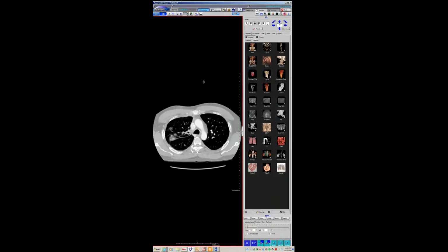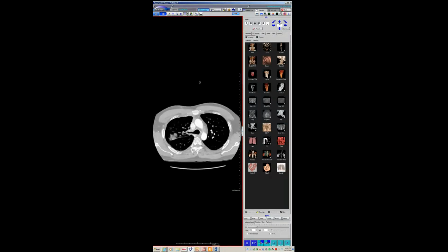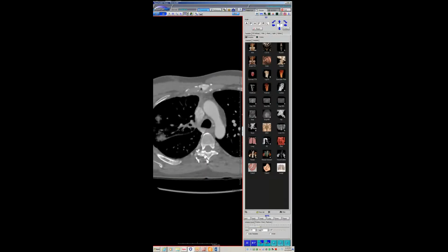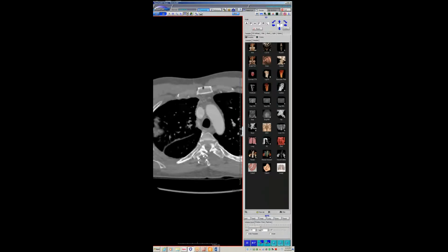It'd be interesting to see if complete fissures were more prone to have venous infarcts like this. That's a very good question. Because, right? Yeah, a lot of times we see the collaterals, but this guy clearly looks like he has a complete fissure. No, that's a good question. I never even thought of that. Because we see veins go out all the time, and I very rarely see infarcts. The only time I ever see venous infarcts is when both veins on the same side are gone.